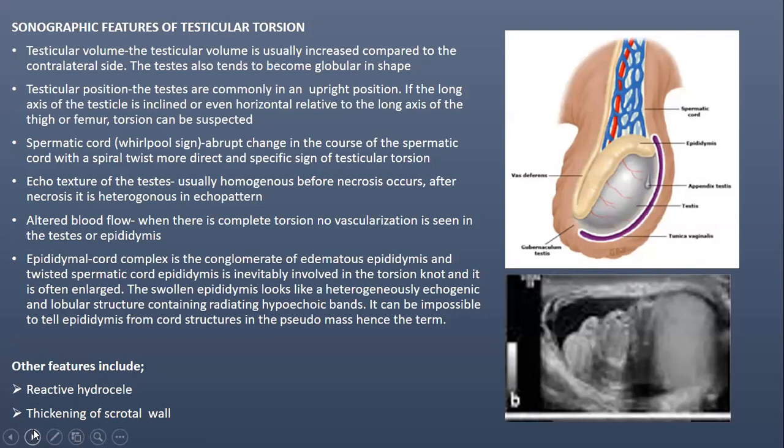which can show you that maybe here you suspect torsion, but that's not what you're going to base on only. You have to base on multiple things.